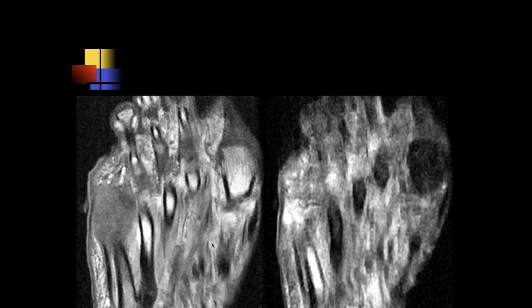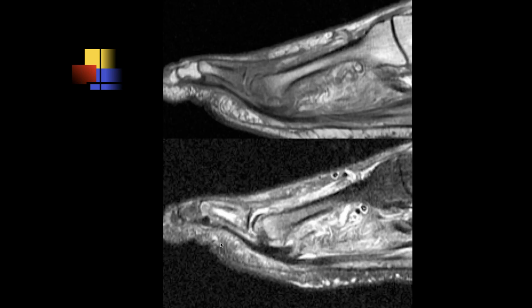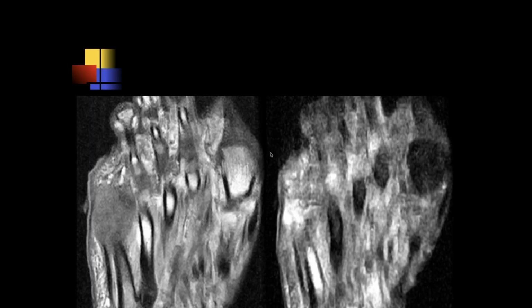Can you go back for a second? Is that skin quite thick, or maybe there was an ulcer there? Or down here? Not an ulcer, but a callus. I'm not sure, John. I'm sorry. Forget what I just said. Okay. I was looking at that tendon. Okay. Wake me up. Jennifer, foot pain.